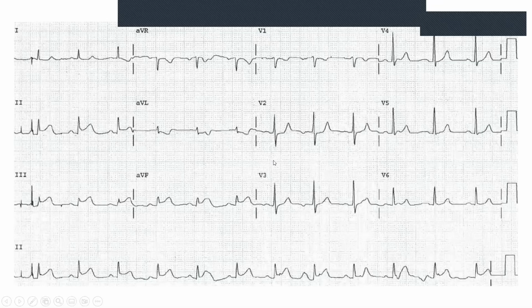So it's a very nice ECG that I managed to come across, and this is actually from X, as it's known now, and was posted by one of the regular contributors there, which is the ECG collector. It's a lovely Twitter handle to follow, or X handle to follow. And yeah, so this was just one that I'd come across that I thought everybody could benefit from.